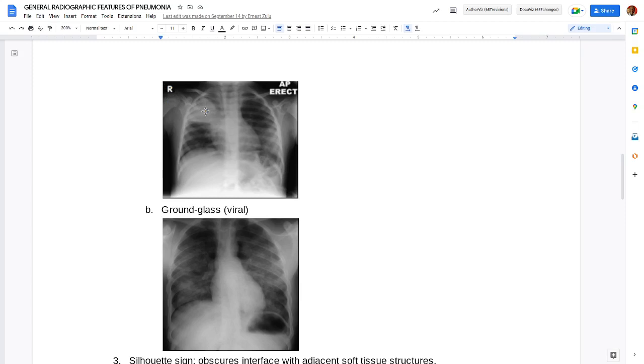That is in the upper lobe on the right, exactly. So it looks somehow symmetrical, in terms of all the regions looking uniformly of the same whiteness. The second thing that it is also demonstrating, if you look at the lower part of that patch, have you seen that? Do you notice that it's straight?